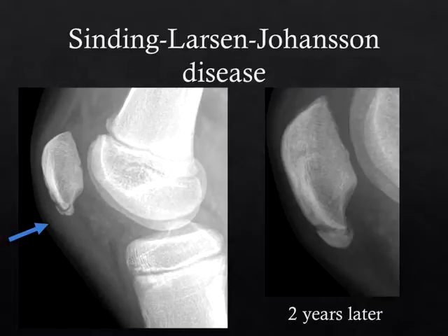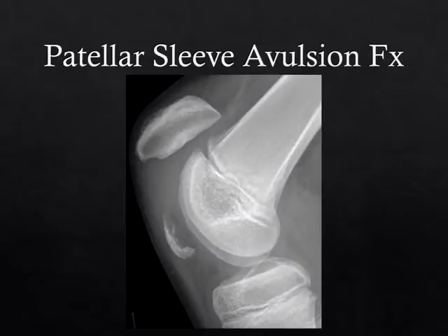This patient was treated conservatively, never did get an MRI, but you can see over time, the inferior pole of the patella, that accessory fragment tends to more solidly ossify. However, it never goes back to normal.